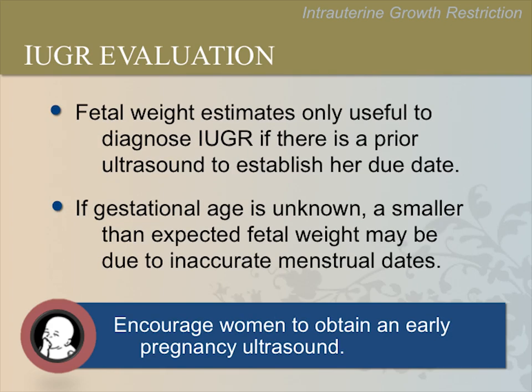Note that fetal weight estimates are only useful to diagnose IUGR if there is a prior ultrasound to establish her due date. If the gestational age is unknown, a smaller than expected fetal weight may be due to inaccurate menstrual dates.